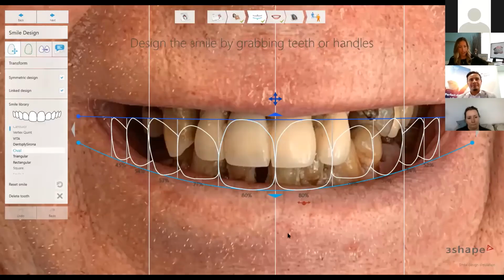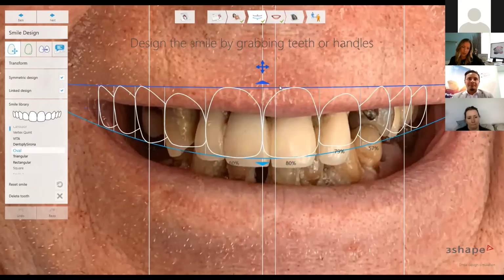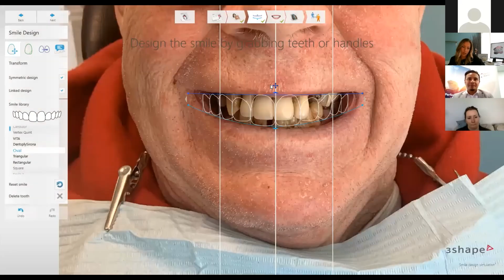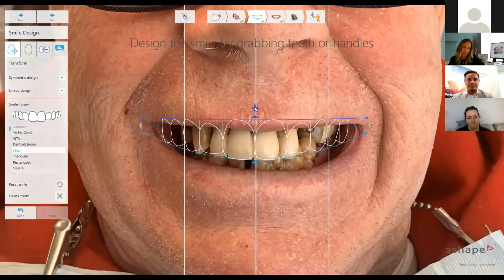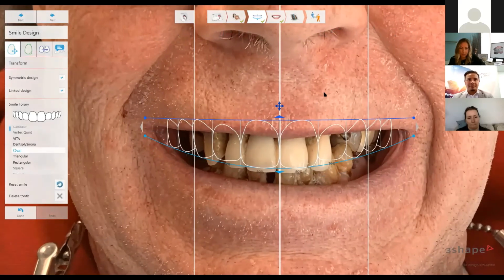So the first thing that I like to do here is figure out the incisal length. That's the number one thing I do here. You can see that this cross is going to allow you to shimmy this wherever you see fit. The software is already trying to align the center line here based off the bipupil and the nasal wings here, but I like to establish the length. For me, I'm looking at his teeth, they're too long. That's just my opinion. We'll all have a different opinion and different shape and size and color on this case.